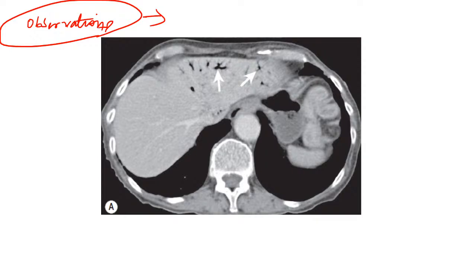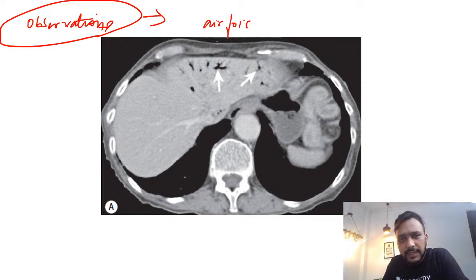So guys, in this image we can see few air foci within the liver.